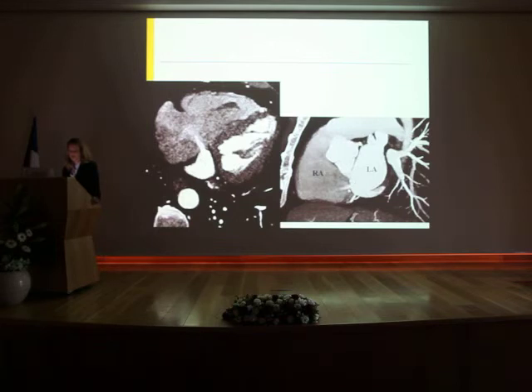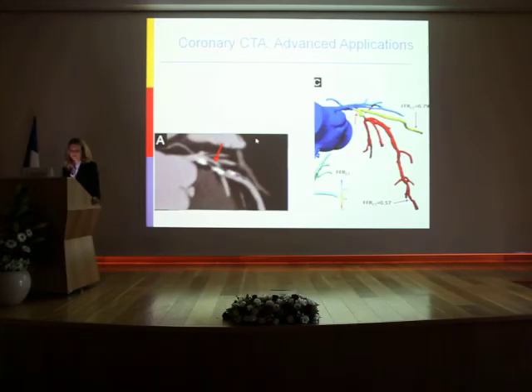This is the shunt, and the coronary sinus was draining not into the right atrium, but to the left atrium. Very interesting. So this is a rare type of ASD, which is called unroofed coronary sinus. And you can see that the right heart is already dilated, meaning that there is hemodynamic significance for this finding. And all this data, including the coronary assessment, was in that same scan.